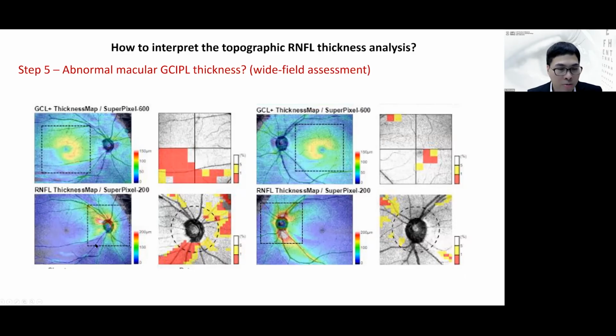Now you can see the wedge-shaped retinal nerve fiber defects over the infratemporal sides for both the right and the left eye, but it's still a little bit confusing to decide whether there are genuine retinal nerve fiber defects over the supratemporal sides of these eyes, because the thickness map suggests a case that it's not that apparent over the deviation map of the RNFL or the GCIPL measurements. The probability map, the deviation maps, don't show abnormal superior loss of the RNFL and GCIPL.